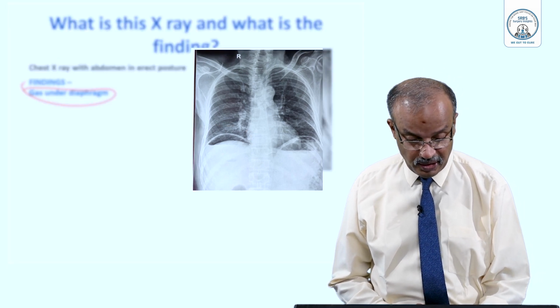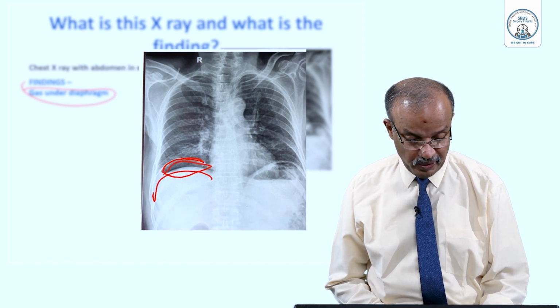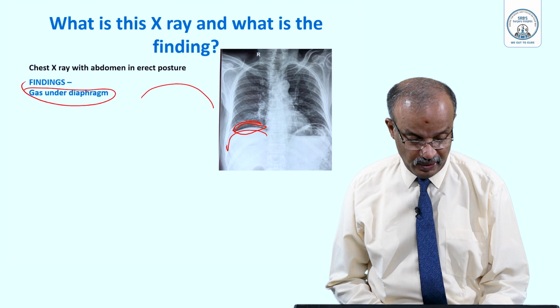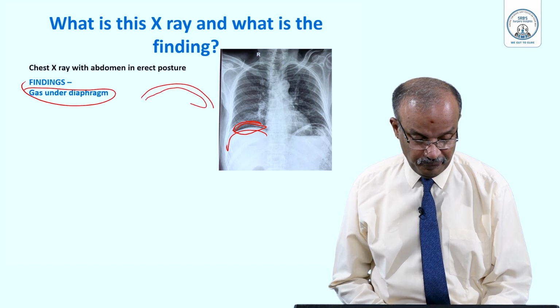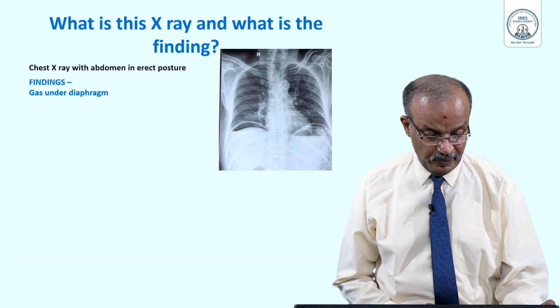And you see that this is the diaphragm, this white line is diaphragm, this is the air column. So naturally liver border is here. So diaphragm is here, this is the air column here, and this is the liver border. So that's how exactly it comes.